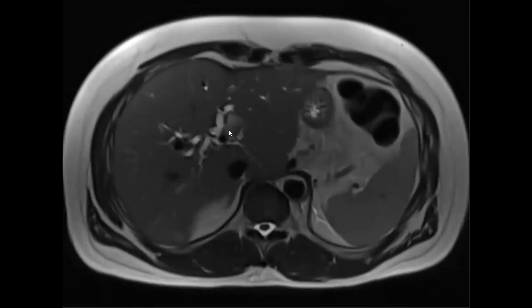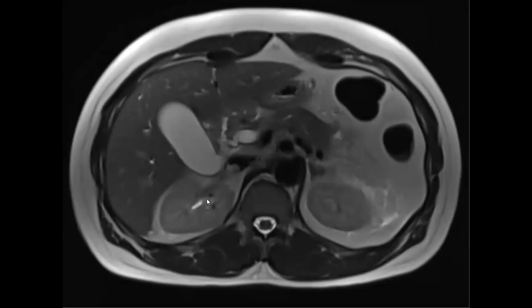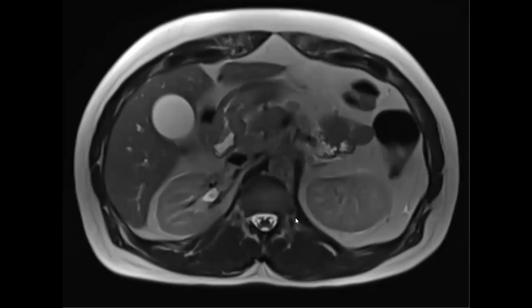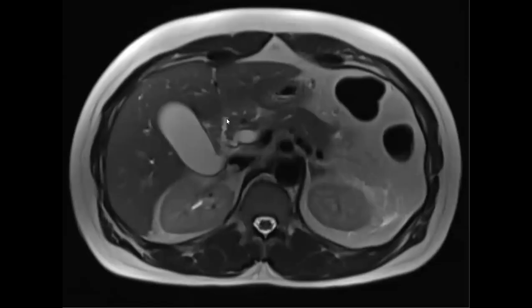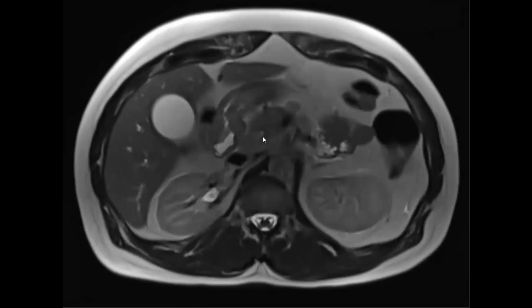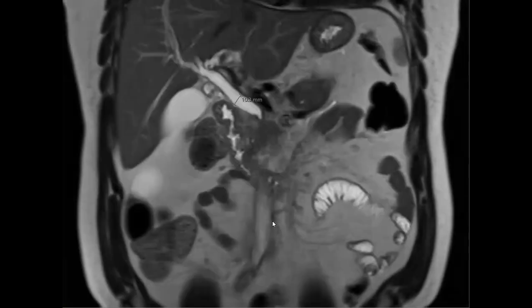Okay, so we can see that the bile ducts are a little dilated. And there's a high intermediate signal right there. Where? Left. Oh, maybe that's just the duodenum. Never mind. Yep, duodenum right there. So the bile duct is dilated, and then we go down into the head, and it looks a little sketchy in the head there. There's our dilated bile duct.